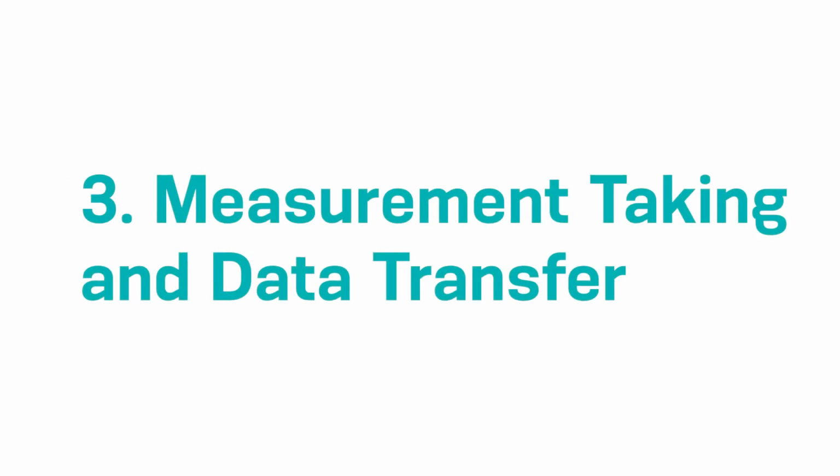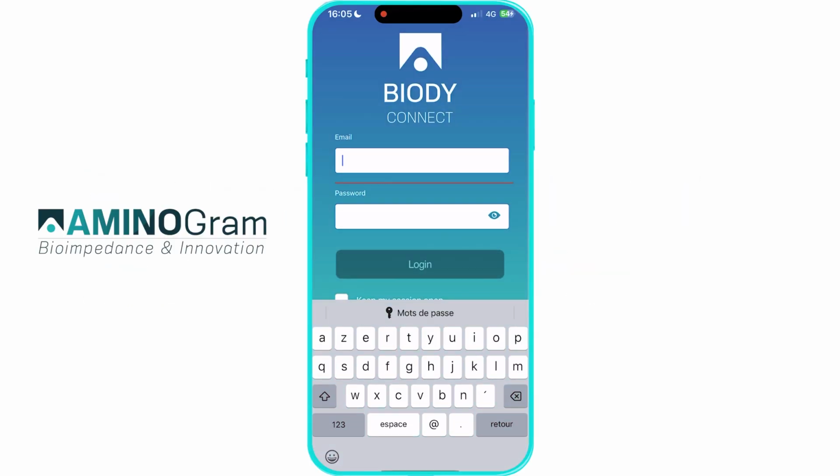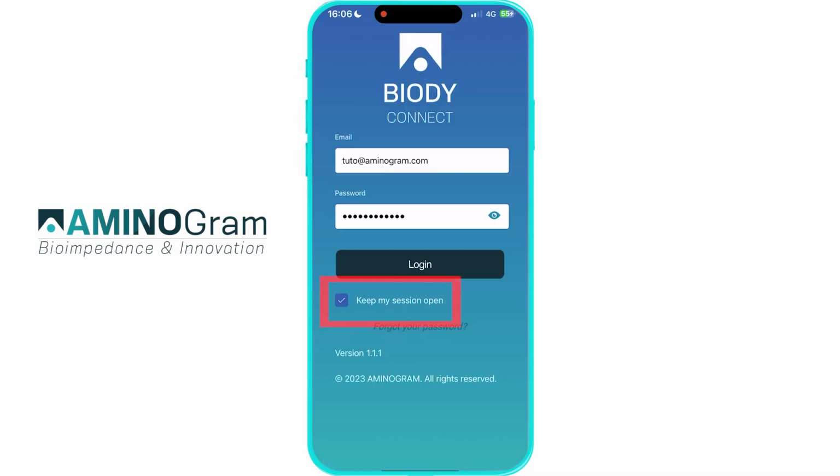Part 3. Measurement taking and data transfer. In this final section, we will detail the steps for creating a patient file, taking measurements, and displaying the results. Now that your account is created, log in by entering your email and password. Check the box, "Keep my session open," to stay logged in for the next use.